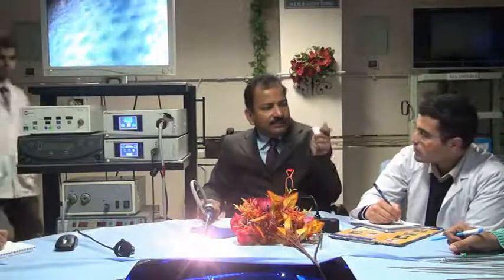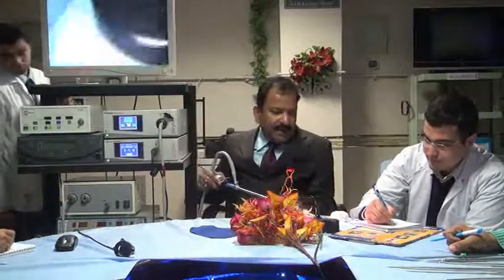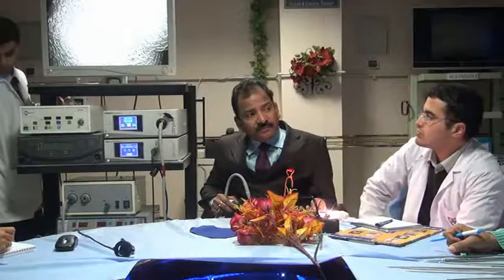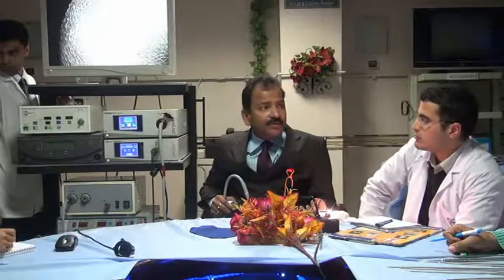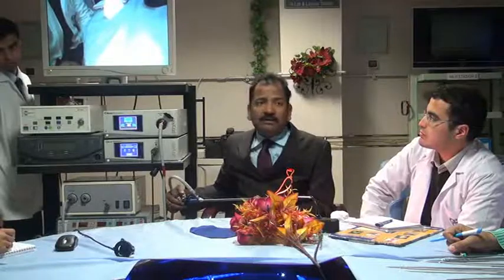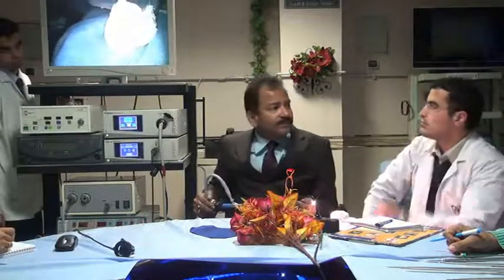Suppose this is your ovarian cyst, and if I have to do an ovarian cystectomy, and if I show you like this, can you perform surgery? You cannot. Because you will see, okay, the entire screen is good, but where is my instrument? If I tell you, okay, do it now, then also you cannot do. It is too far. But if I bring it closer, then you will say, okay, it is fine now.